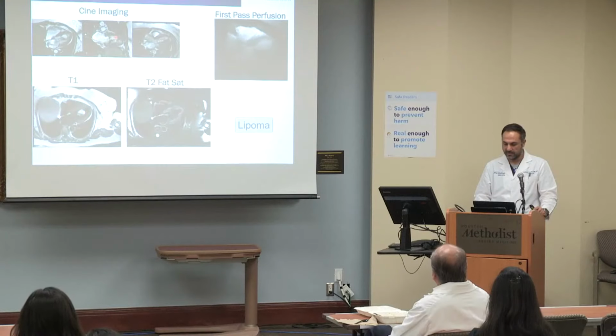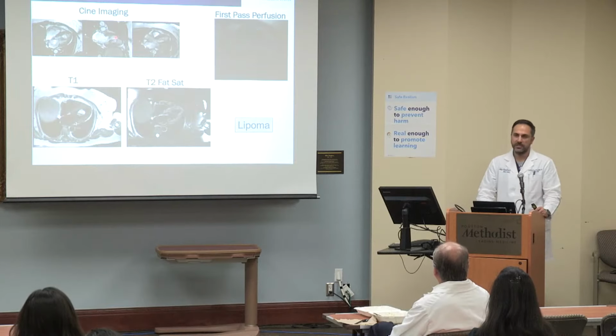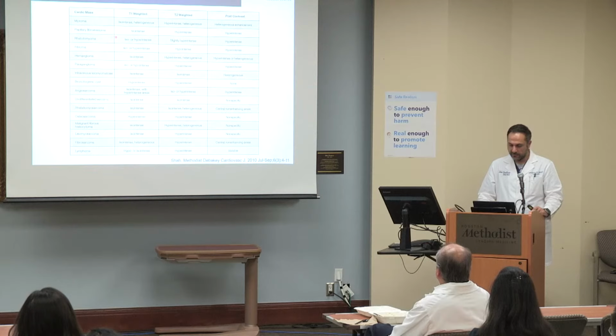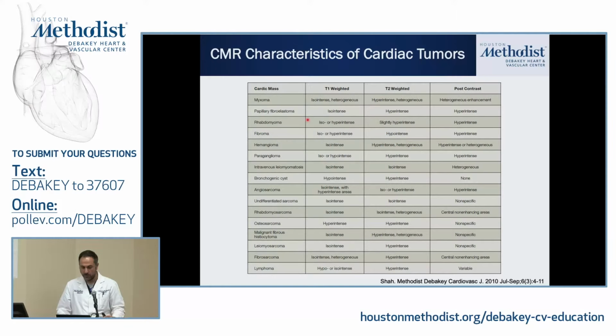Again, no or very minimal first pass perfusion, and also the LGE was very minimal. This is, again, a review from Dr. Shah. I'm not going to go over all of this, but this is something that we use in the lab whenever we see a mass. We look at the T1 signal, T2 signal, post-contrast, and then put things together.